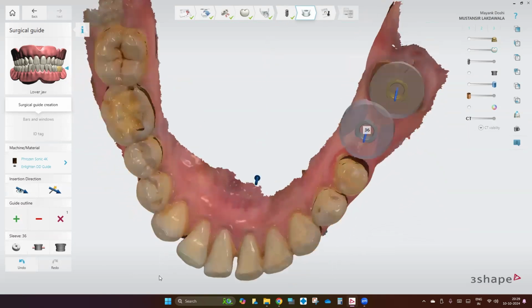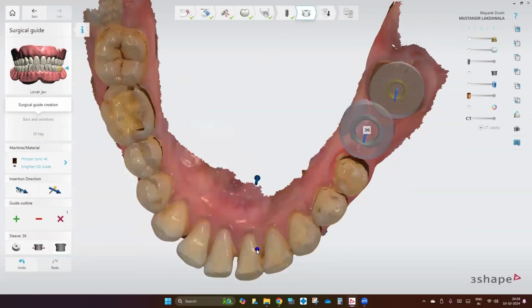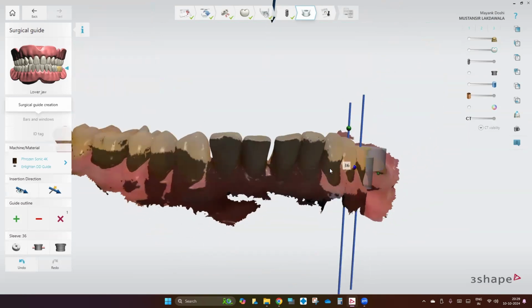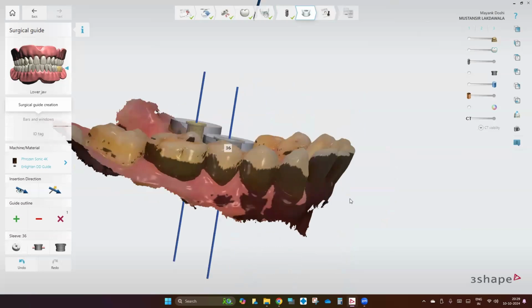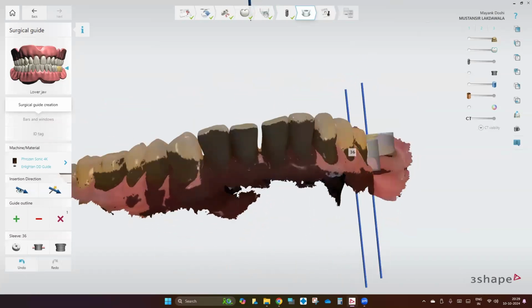One important thing for all you guys is that when you get scans from patients, scans from doctors, they need to have a perfect buccal surface. Can you see the proclination? At least 60 to 70% of them will send you bad impressions where there will be complete drag marks over here. Please do not accept those impressions because your guide will not fit and eventually you will take the blame. Am I really clear with you guys?